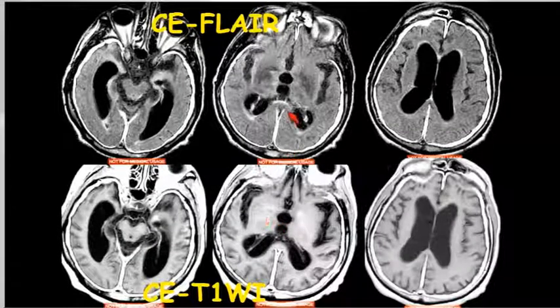Here are some more examples illustrating contrast-enhanced T2 FLAIR versus T1. In this case, it's that dural pattern of enhancement. Again, this is relatively nonspecific, not as specific as that subarachnoid leptomeningeal enhancement. You'll see this with low pressure situations as a delayed effect after craniotomies and other conditions. In the context of infection, you will sometimes see this as a reactive secondary effect after an infection, particularly viral infections.